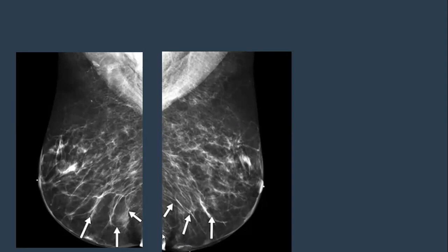The skin thickening with calcification. Thickening, yes, without calcification. Okay, focal areas, maybe. We accept, no problem. We can accept some calcification, not clearly seen, but the added density might reflect that some calcification is there. I could not appreciate it well, but it might be.